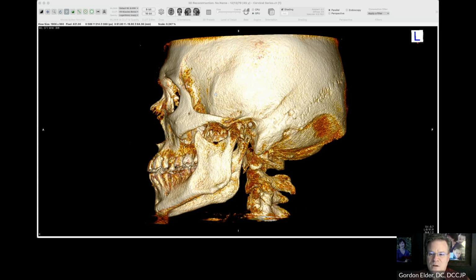And I can just do my biomechanical analysis, my articular analysis, and not have to worry too much about anything I might not be seeing. But anyway, this is not a pathology tutorial. This is not a program tutorial. This is how to look at a cone beam CT scan and get some useful information out of that, either just how the bones have moved or how they've moved and how to move them back into place. And we find that information much more in the Blair seminars, which I do teach.